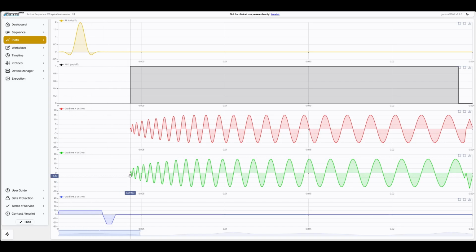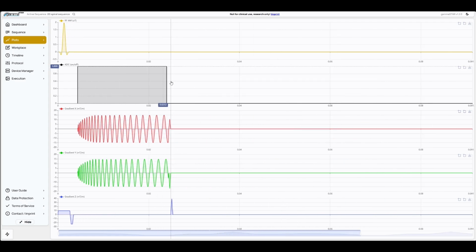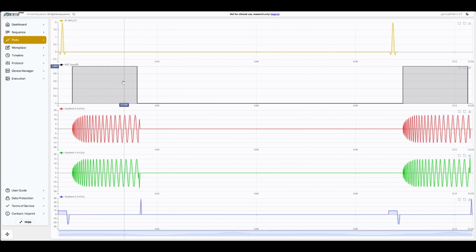And afterwards, we see that we start from the central k-space, as we only have small gradients, and then with small amplitudes, we spiral our way into the outer parts of k-space, while we have an acquisition window which is turned on, like the ADC event, for the whole duration of this spiral. And we do that 2 times, so this spiral is slightly shifted when compared to the first one, so we acquire additional and different k-space data with this one than with the first one.